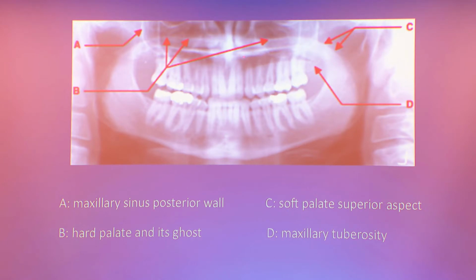If you imagine a PA, and you see the inverted Y configuration on a cuspid premolar image that we'll sometimes see, the inverted Y would have the stem here being the posterior aspect of the nasal cavity floor, this branch of the Y, maxillary sinus floor, this branch of the Y, anterior portion of the nasal cavity. So again, nasal cavity floor and hard palate are all blended in together on the pan.